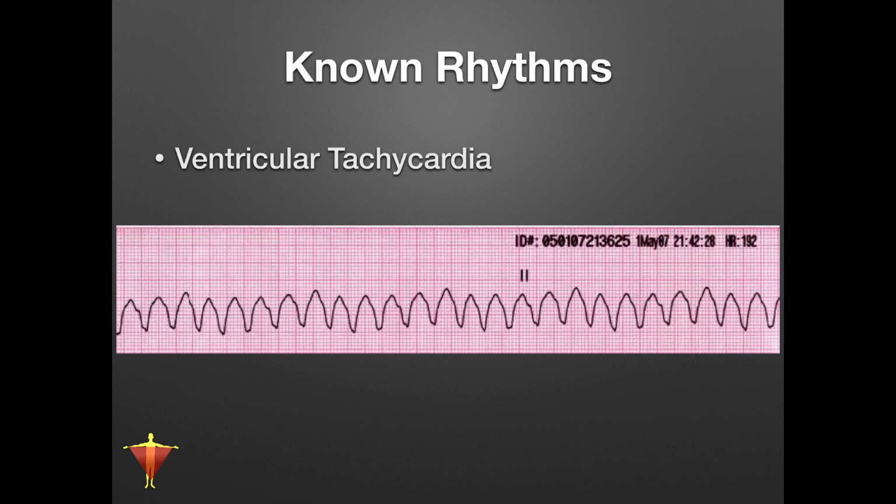And again, this can be rectified by shocking the patient. And again, we're going to be looking at them. Maybe they're unconscious, but they're showing this rhythm. Well, that needs to be addressed right away.